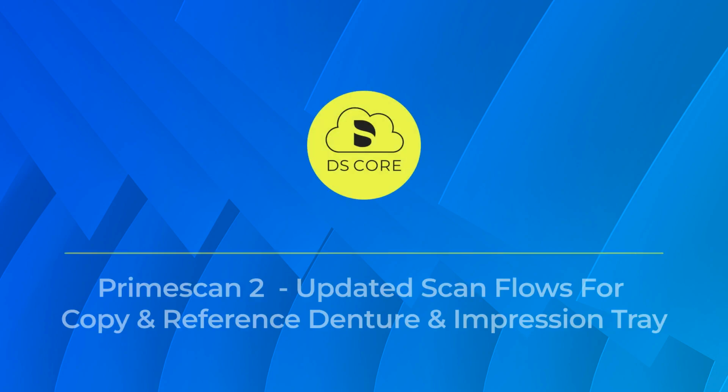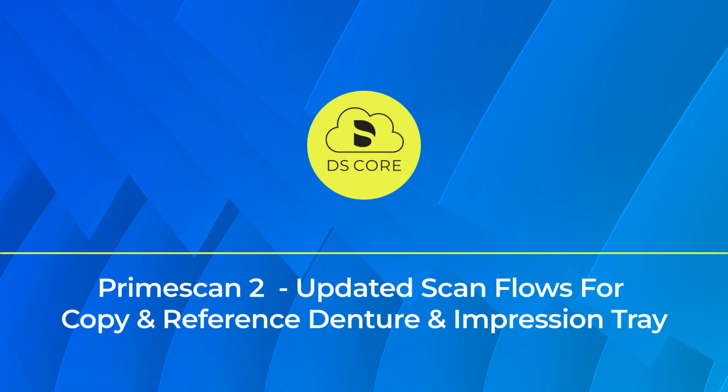The following tutorial describes the updates on the Primescan 2 scanning flow for reference and copy dentures, as well as impression trays. Let's begin.